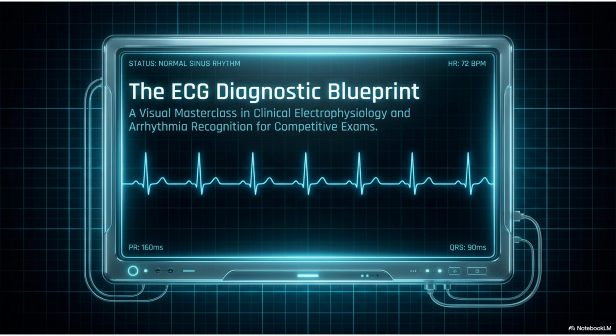Welcome to the ECG Diagnostic Blueprint. This series is designed to help you master arrhythmia recognition by linking electrical tracings to actual cardiac physiology.